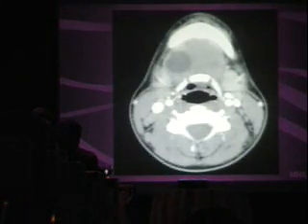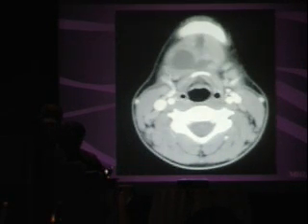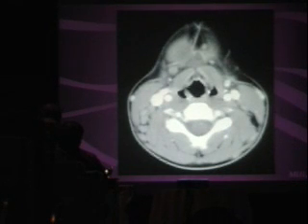Here's something that you might think is a ranula, a cystic lesion out laterally. Not quite clear if it's submandibular or sublingual. But again, you're getting one snapshot here. You always have to follow up and down, look at the full extent of the lesion. And if you follow this all the way down, you actually see it's breaking through the thyroid cartilage. There's a cystic lesion in the midline that got so big it kind of just dissected up into the submandibular and sublingual space. So this isn't a ranula at all.